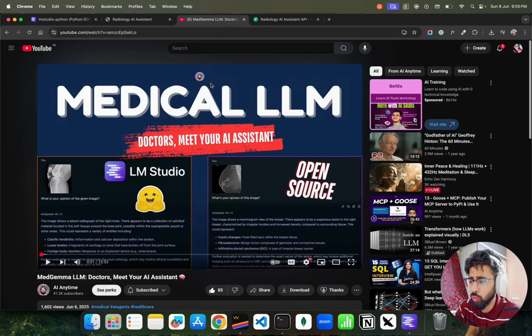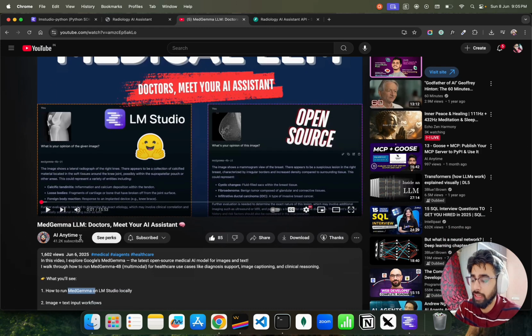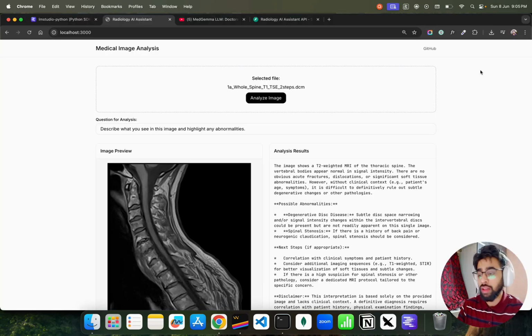I recommend that you watch the previous video, MedGemma, on YouTube. Go to the YouTube channel AI Anytime and watch the video MedGemma LLM, right? So for the Radiology AI Assistant, make sure that you have installed LM Studio and it's up and running. I think that's all I wanted to introduce in this video, guys, on how we're going to build the Radiology AI Assistant using an open source stack, completely open source, no paid APIs in this project.